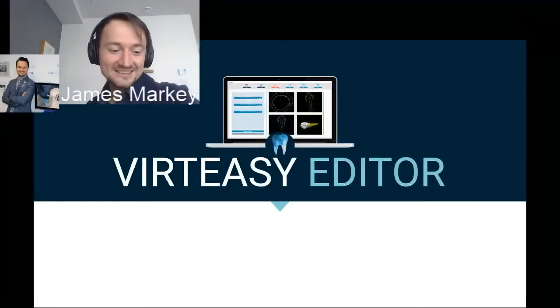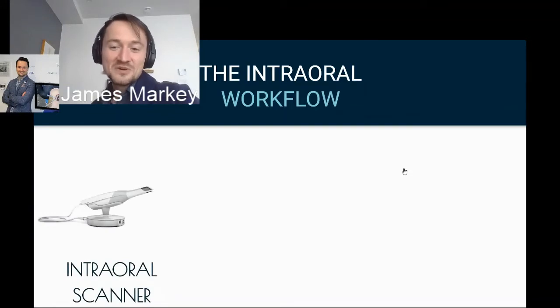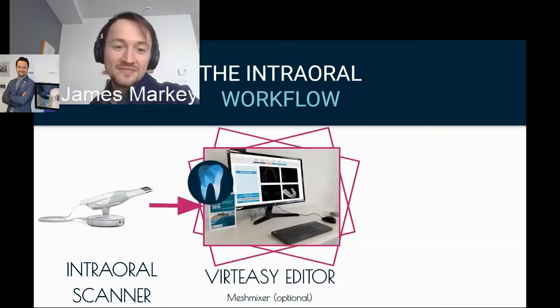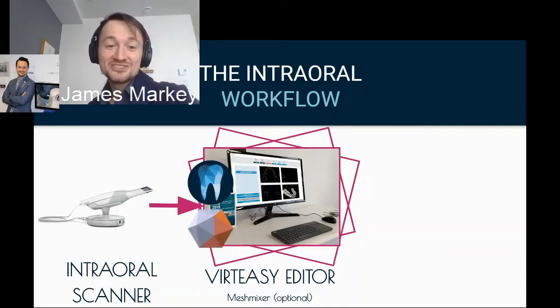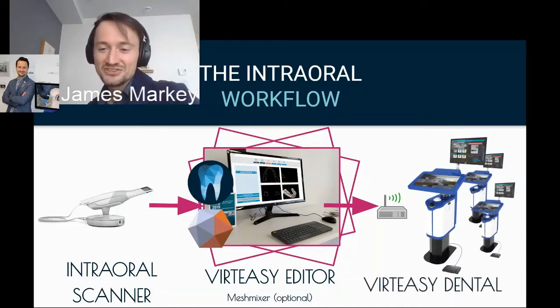So let's get started. Today we'll be using Virteasy Editor to complete this workflow, and the workflow starts with an intraoral scanner. We're able to take a scan from a real patient and then export it in an STL format, which works fantastically with Virteasy Editor. We can also make more complex cases using Meshmixer, which is a free program to download as well. Once we've completed that, we send it over to our server, and then it's available on all of the simulators in the simulation suite. Nice and easy, nothing extra to do there.